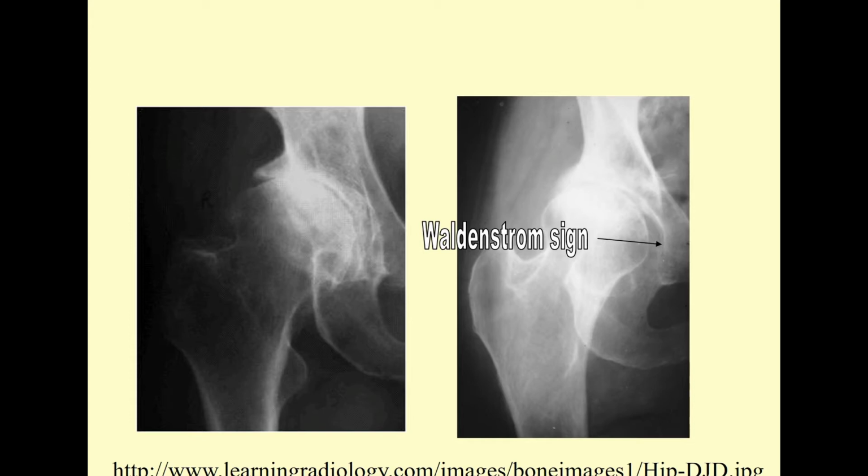That almost certainly could be the first stage of an inflammatory process where the articular cartilage is thickened and swollen, which will push the bony elements apart. We also see that in early cases of infection, where again the cartilage is now swollen and thickened because of the infection process, and again forcing the femur head, in this case, out. He also tells us that no teardrop distance should be different from one side to the other by more than 2 millimeters.